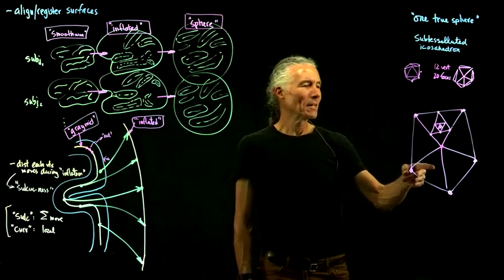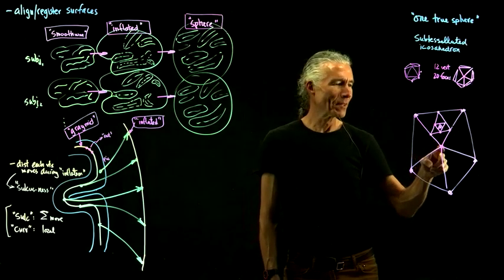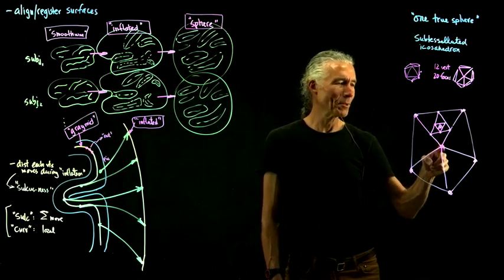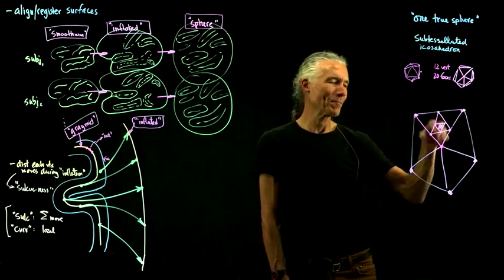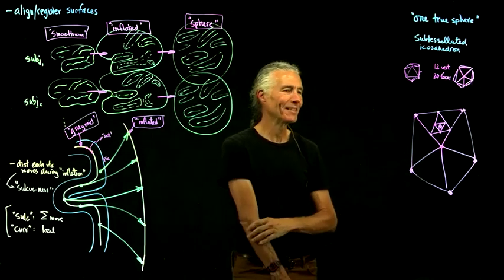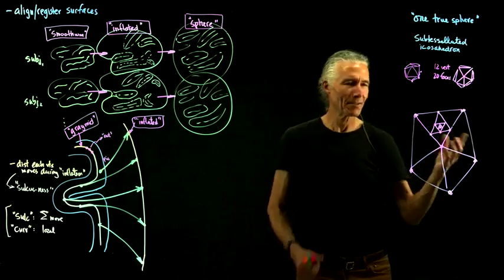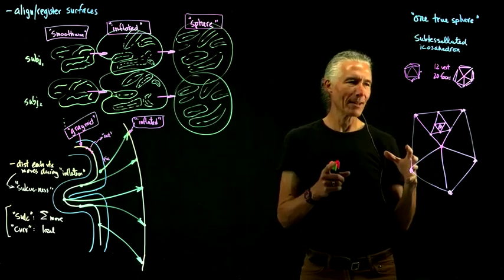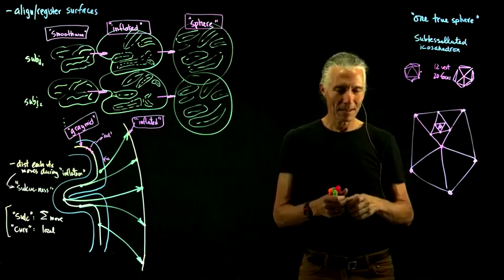So if you just look out at the screen before they start the movie and try to spot the 5-fold, there's just a couple vertices in that screen that have only 5 triangles coming out of them. Everyone else has 6. So basically, that's what the one true sphere looks like. It's got like 160,000 vertices, 10 centimeters in diameter, evenly spaced. The vertices are all evenly spaced.